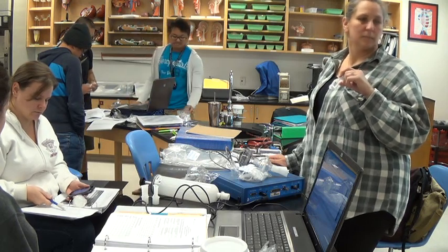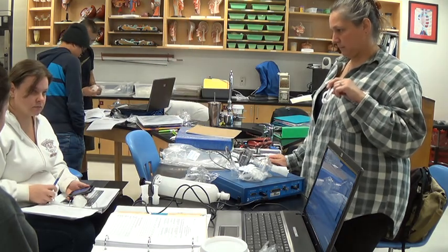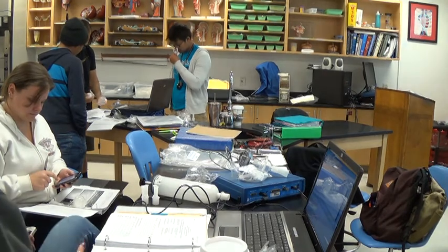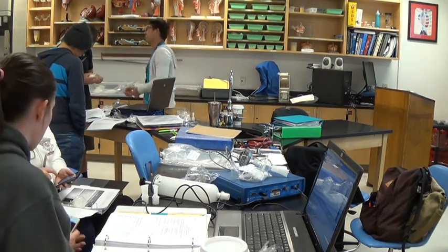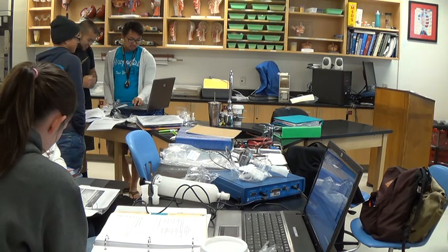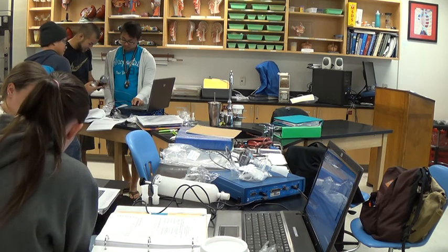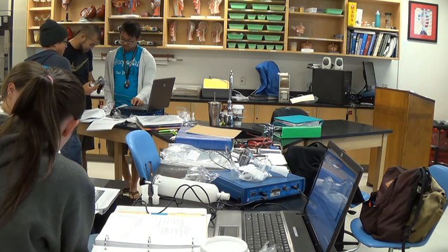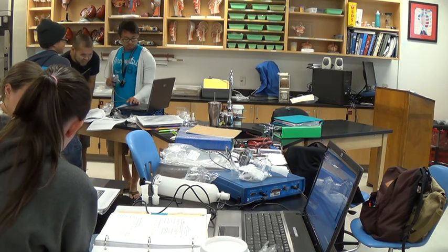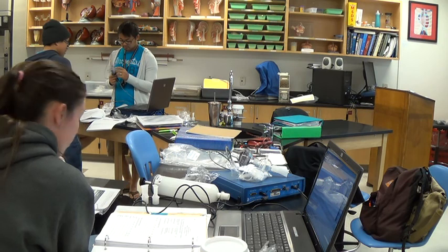The maximum inhalation, subtract that from exhalation. So is it down here? So maximum exhalation. Well, here's one too, right? Drop, inhale, and then exhale. You're not quite at the beginning. Well, no, I was going to highlight a new one because that's the old one. So I'm saying right here, would this be the trough with the maximum exhalation? Because here's another bump. To the maximum, no, you're down here, right?